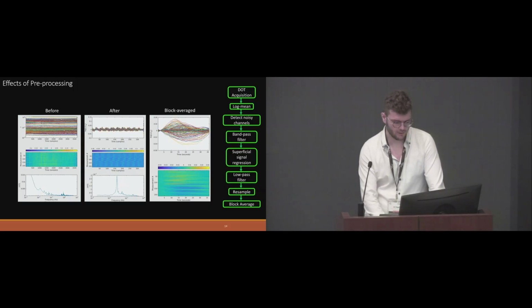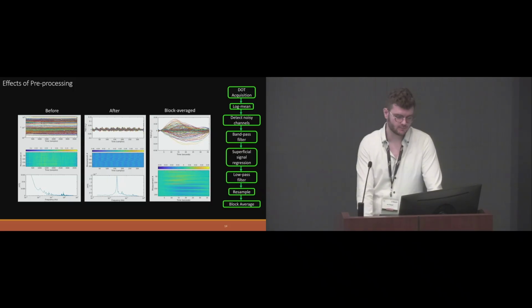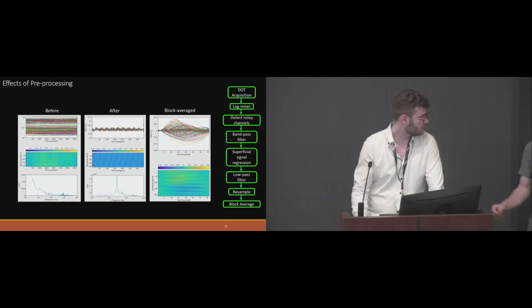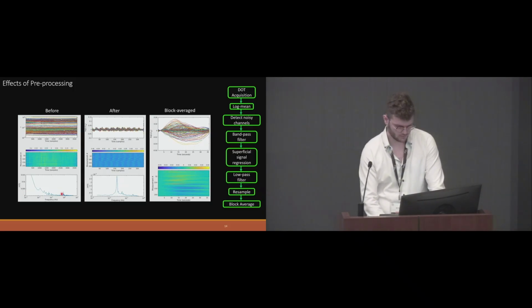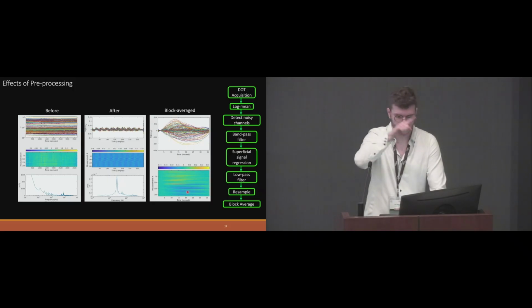We can see pulse peaks down at the 10 to the 0 mark in that bottom left part. After processing, we can now see a, oh, fantastic, thank you. So yeah, pulse peaks down here, and then after processing, we can see our stimulus peak is very noticeable in our data, and then we can also look at block averaged data over here, where the top part of the plot indicates optodes on the left side, bottom part of the plot, optodes on the right side for our blocked average data, where that checkerboard is rotating in a circle.